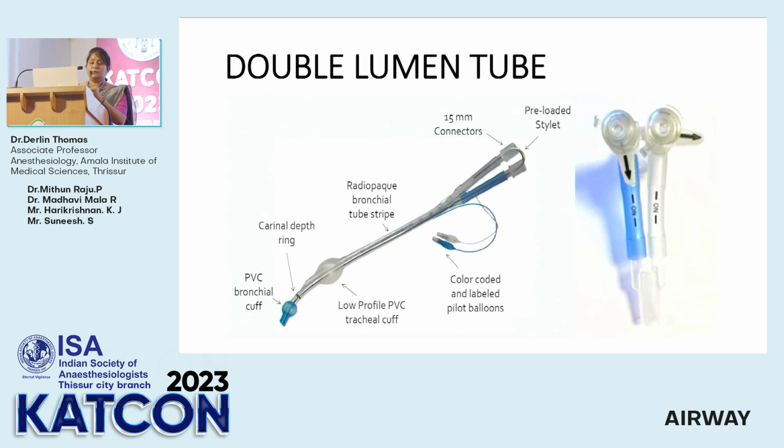The bronchial tube is color coded, which is usually blue in color, and it has also got 2 cuffs. The bronchial cuff, which is blue in color and smaller in size compared to the tracheal cuff, which is bigger in size. It also has got 2 pilot balloons to inflate both these cuffs separately. And on the right side, you can see the Y connector, which is used to connect this tube to the circuit of the machine.